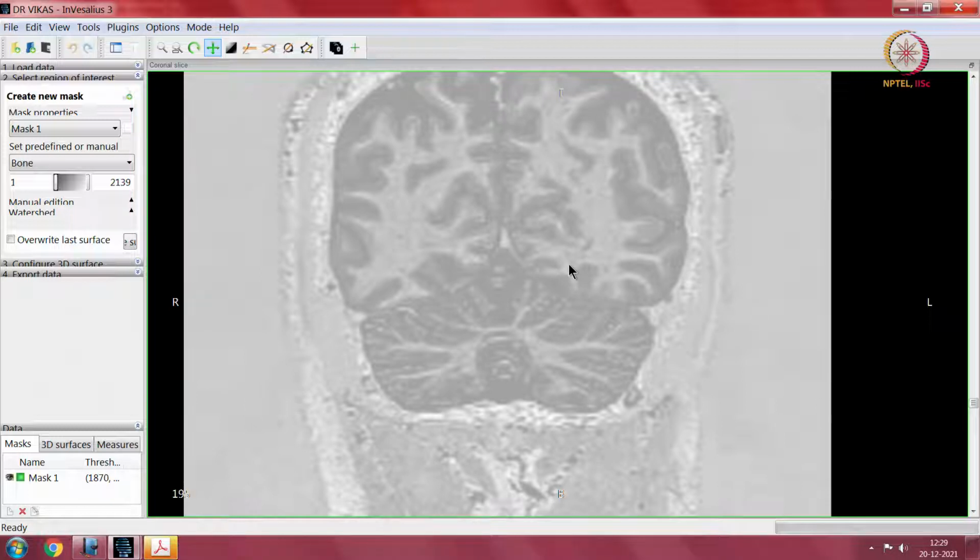There is a lot of gap between what is seen on imaging and what is actually present. These are not mythical structures, they are very nicely seen, but unfortunately on imaging, even with 0.6 mm resolution, we are not able to differentiate these things. It almost looks like there is no boundary between the cerebrum and the cerebellum.